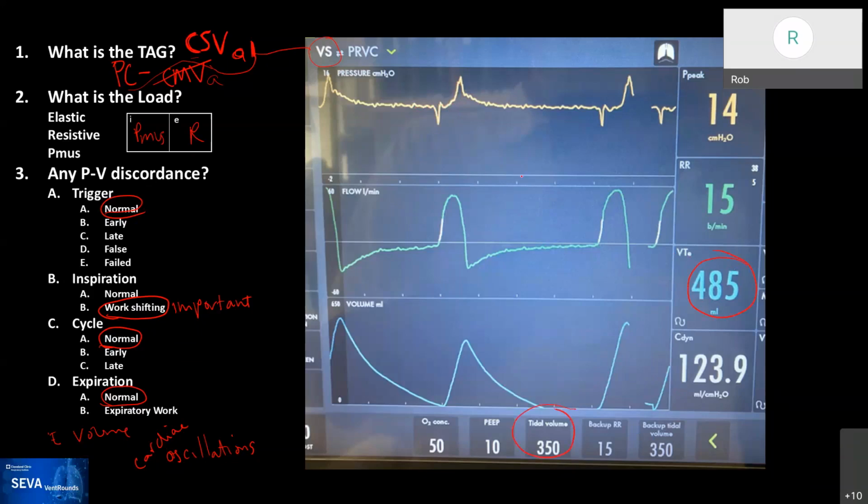Yeah. So in this ventilator, the argument is that the algorithm takes you to 0 when you are consistently above the tidal volume, so it continues to drop the pressure until you're at baseline. So I think that's what you're seeing here. Right. That it has taken essentially no support. It pressurizes, but pressurizes to 0. So Ariel's right. Effectively, it's CPAP at this point, right? Exactly. Even though it's not the mode, it's sucked down the support so low that it is effectively CPAP.